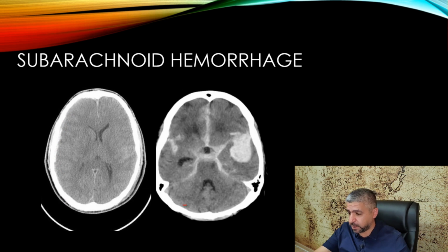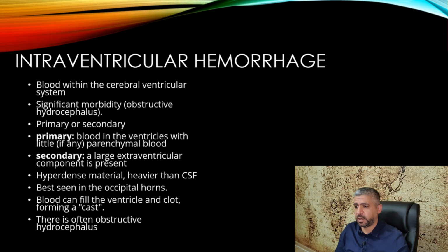Another example, you can see here the subarachnoid space is filled with blood all over. The cisterns are all filled and it's like a star, pentagon sign. And what is this here, this big hyperdense something? Well, of course, it's a large aneurysm of the left middle cerebral artery. This aneurysm is the one that's ruptured and forming a large clot or hematoma.